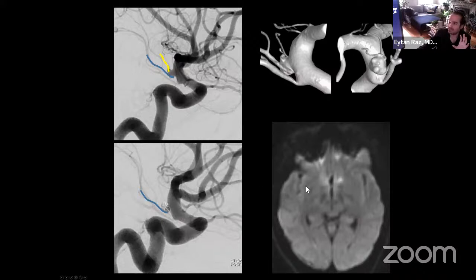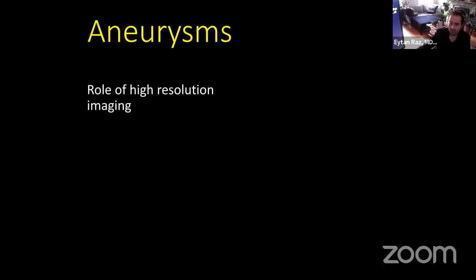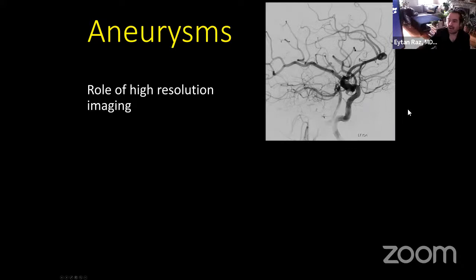In this particular case, this didn't have much clinical impact. This was asymptomatic, but it is a very good example to show how you can understand very small branches that otherwise on your 2D imaging, or your traditional 3D DSA, would be impossible to recognize. So the role of DynaCT, or use of cone beam CT in aneurysms, is really to show things with a higher resolution.